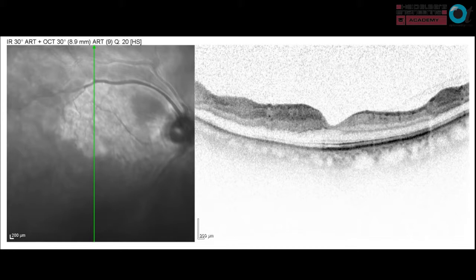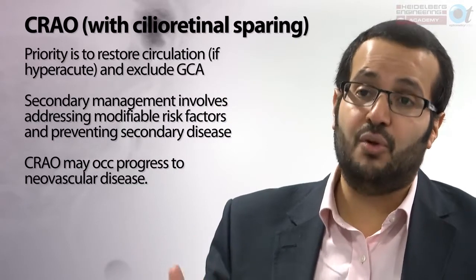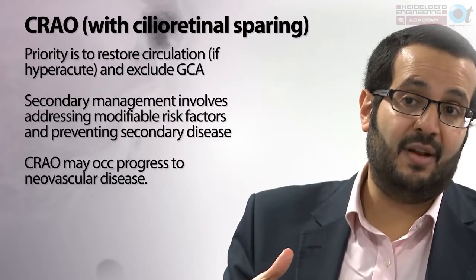That's because you've blocked the retinal artery, which supplies the oxygen to the inner retina, and therefore you get inner retinal edema and inner retinal hyperreflectivity. Very few things give you this very characteristic OCT appearance, and these patients, again, need to be referred to hospital because we can restore circulation if we catch them early enough. We also need to exclude giant cell arteritis, but they also need to be referred to the stroke services because they're at high risk of developing a stroke.